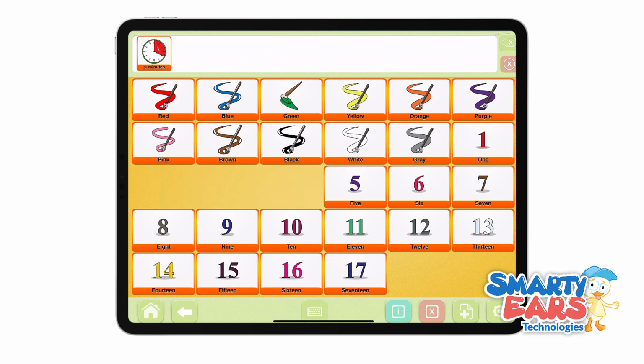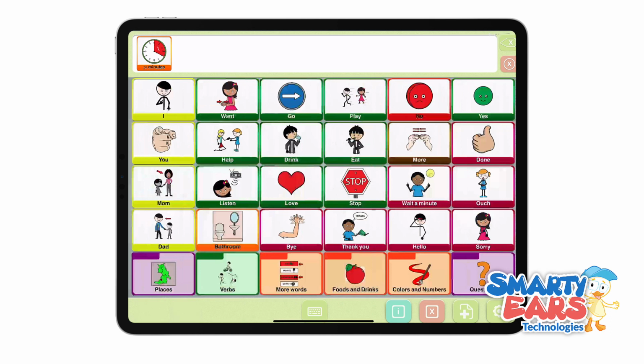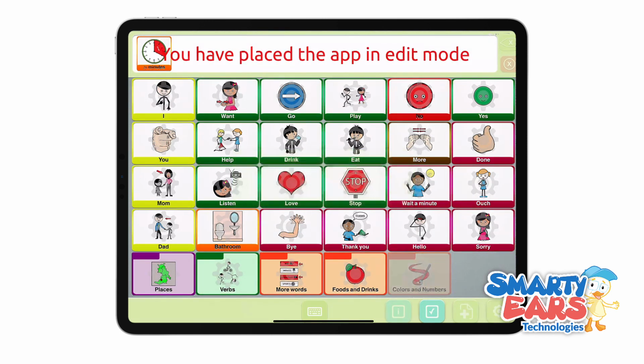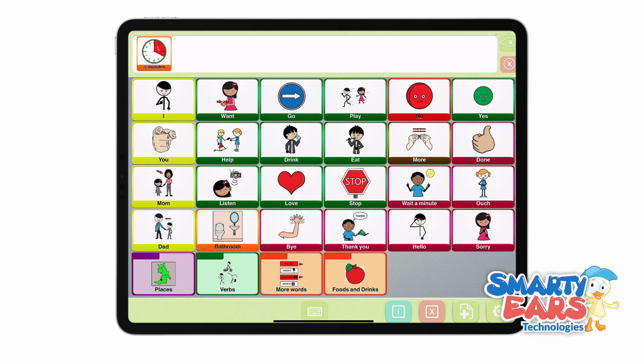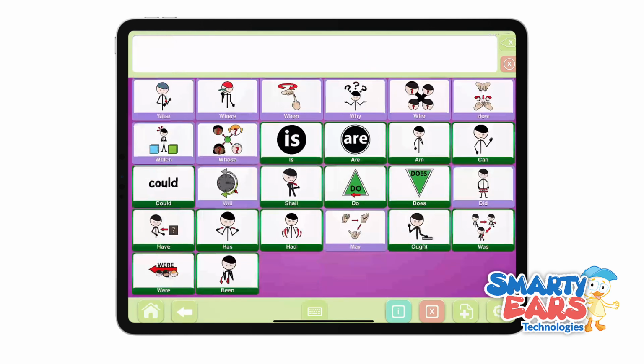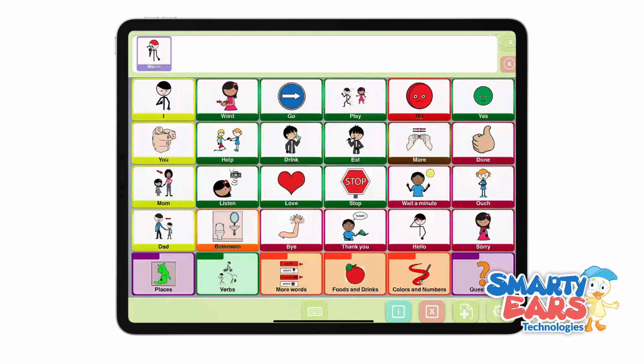This is extremely important if you want to keep the icons and you want to slowly introduce them. So for example, here I could hide these other folders. I hit those two or three folders, and I can place them back on the screen to unhide them. And they come back to their original state.